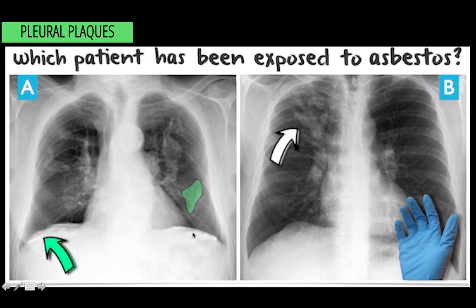Patient B, on the other hand, we can notice that we don't have pleural thickening on the diaphragmatic surface, and as we can see, we don't have as clearly defined plaques throughout the lung parenchyma. But what we do see is these areas of dilated bronchi within the right upper lobe, and this occurs mostly in asthmatics and produces what is described as a finger in glove appearance.